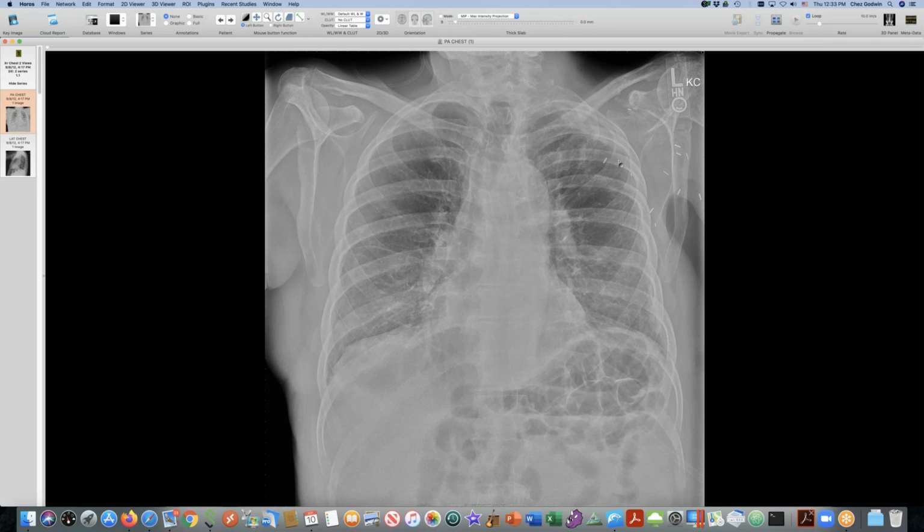So there was a shoulder CT that was done, I think in 2018 or 2019, and they saw this destruction of bones, and they hypothesized that this might be Milwaukee shoulder or something like that, which we thought maybe that's neuropathic, but we looked it up and it turns out it's a CPPD manifestation, calcium pyrophosphate deposition disease. That was the working diagnosis based on a CT from a year or two ago.